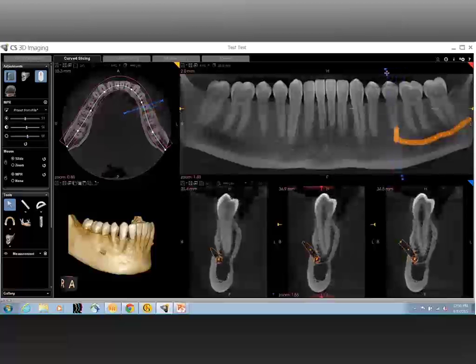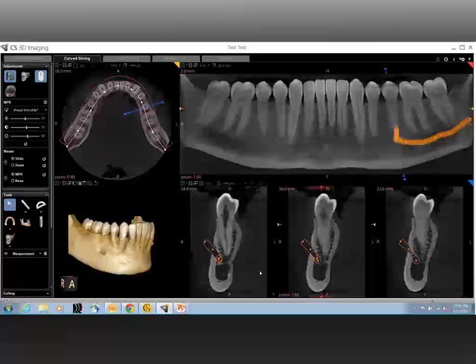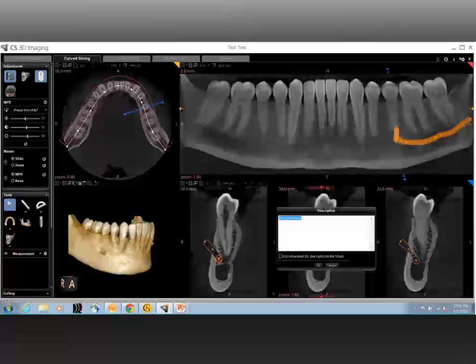Interesting. So going back to all these findings that you have mentioned, is it important to note these findings, and if so, why? Oh, that comes to essentially bookkeeping, and that's a very good question. It is important. Once you see a finding, it is important to note them in the patient chart because it shows that you have interpreted the scan, you have noted the findings, just like how you do it on a two-dimensional radiograph. And it's a process of bookkeeping and also for medical legal reasons.